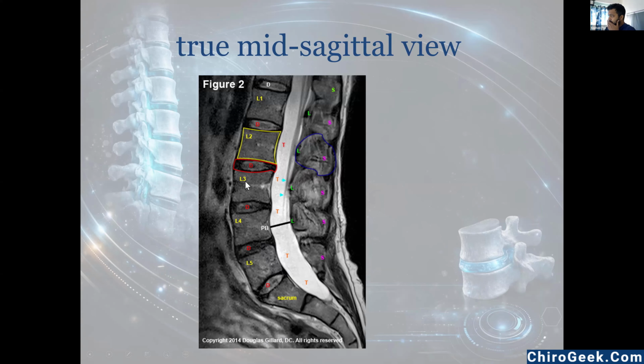And you can see all the anatomical structures like vertebral body, disc, the spinous process, and this thin layer at the back is the ligamentum flavum, which you can see. And there will be a thin layer here also, that is the posterior longitudinal ligament. And we can also see the spinal cord around it. So in the mid-sagittal view, the main thing we are seeing is anatomy.